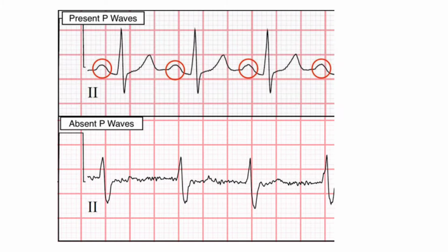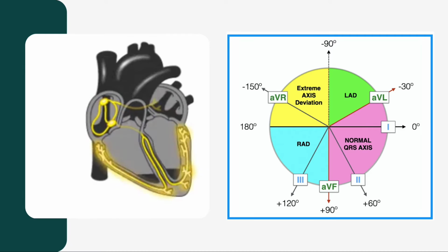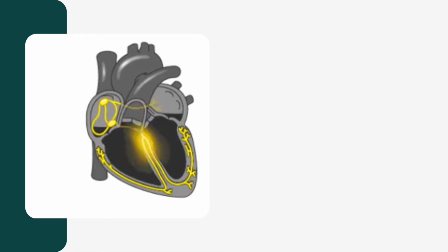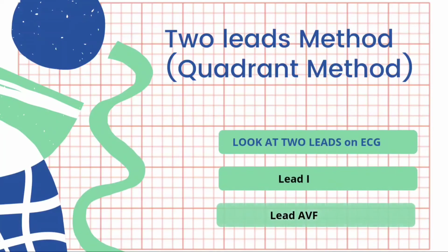Similarly, P-wave and T-wave axis can be determined. Abnormal QRS axis deviation has significant impact on normal ventricular functions. There are several complementary approaches to estimating QRS axis. First of all, we will learn about the two-lead analysis method, which is the easiest one.